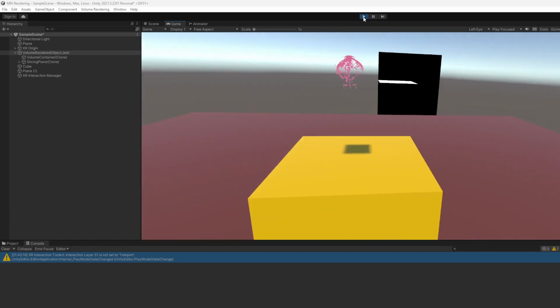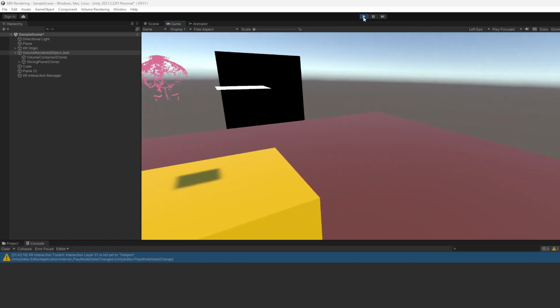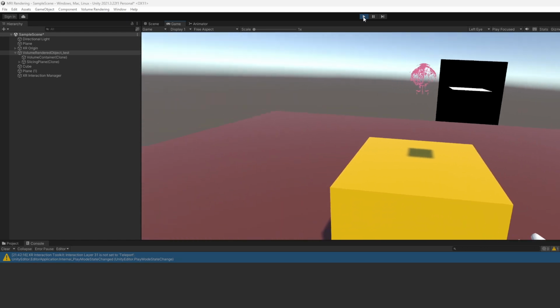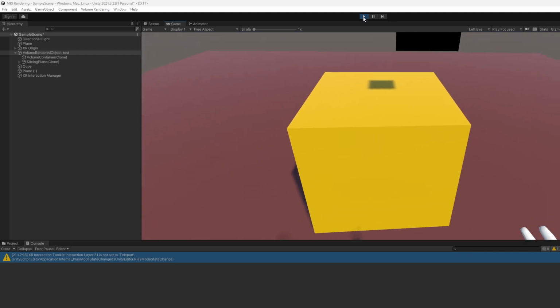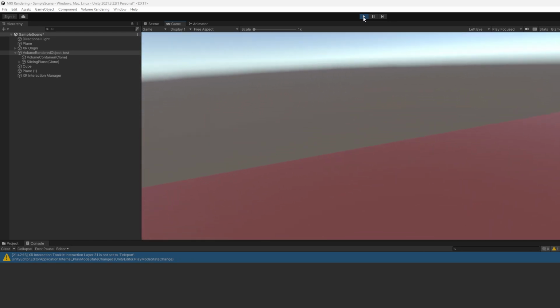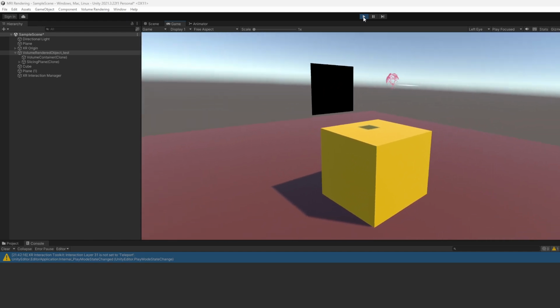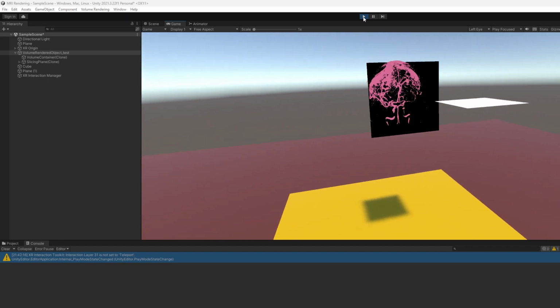So I'm in the VR environment. I've deliberately kept it really simple to just show off this effect. I could make a nice little lab environment or something in VR, and that would really help with presence, but I think the point of the project was to show this interaction, not necessarily to do anything with the immersion. So I've implemented some stuff like continuous movement, which is in head direction as opposed to controller direction, as well as snap turning. There's also teleportation movement available and continuous turning, but these are just the settings I have on because I find them the most comfortable.